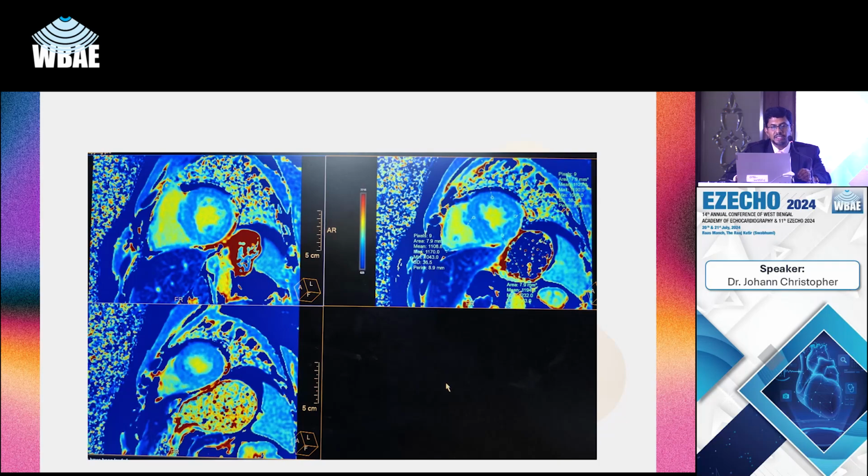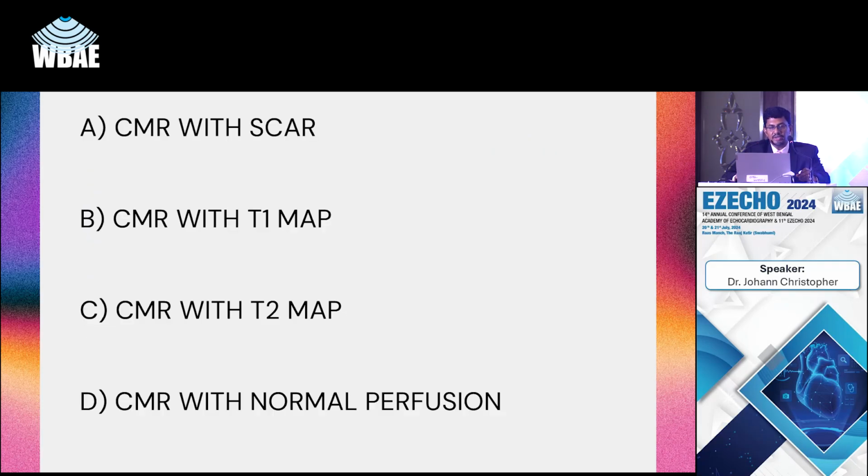Question number 8. It's a 28-year-old male marathoner with VPCs. You've evaluated him on the echo and it showed a septal hypertrophy, and then you did the MRI. These are MR pictures. And I will try to not put an arrow, but my arrow is pointing to the pathology which is shown there. I'm sorry.